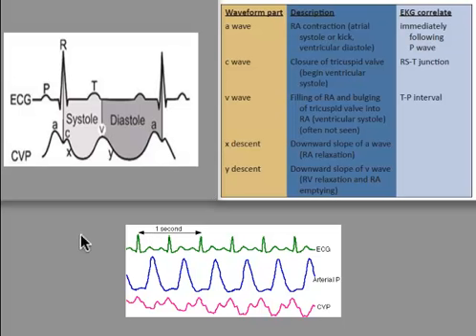And then below is an EKG, an A-line waveform, and then a CVP waveform. So we can refer back to these as we go forward. So let's look at a standard CVP wave. It's got sort of three distinct parts that correspond to a beat of the heart.